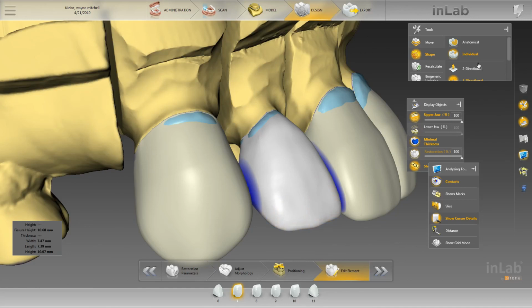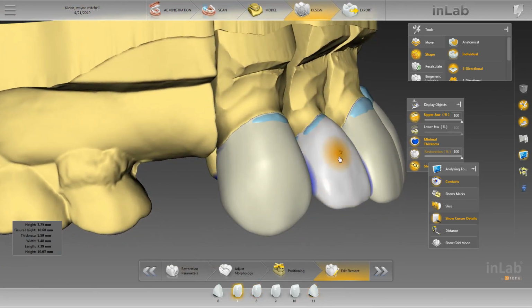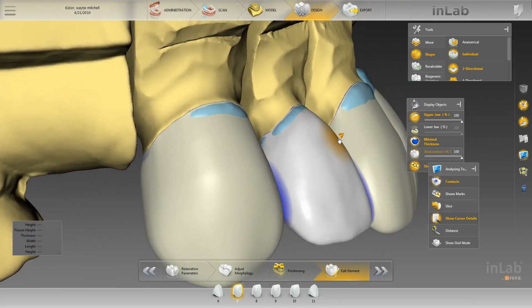And from there you can define the whole contour line a little bit more by just looking at it from an angle and bringing it out like this. And you want to keep the circular tool somewhat small in size so that you're really defining everything. You're zeroing in on one area. It's nice.